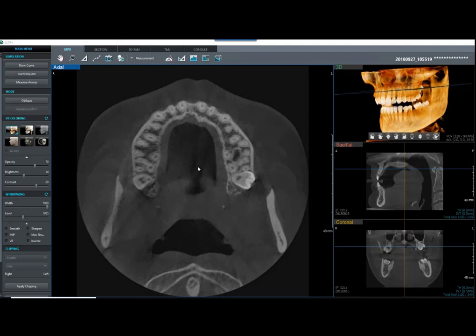And let's just stop right in here. What I have my doctors do as we're scrolling through this is we're identifying our anatomy. We can see our molars here. I always look for fourth canals on my first molar. So I can see a canal here, here, and we're going to look at this later on tooth number 3 for a possible MB2 there.